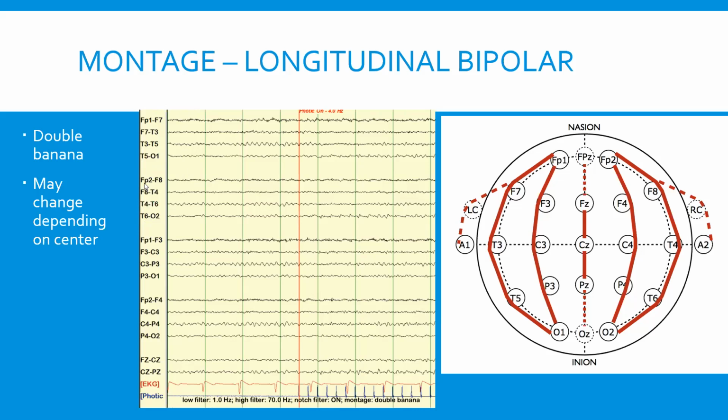So here, FP2, F8. Oh, I'm sorry, I'm getting myself mixed up. So FP2, F8. This is why when you're reading EEG, the first step is you have to look at all the numbers. So this is a left temporal chain, and this is a corresponding right temporal chain.